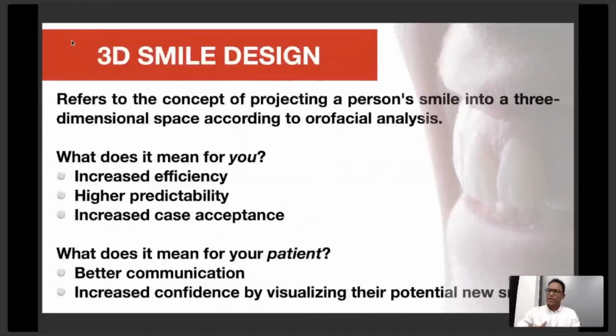So what is a 3D smile design when it comes to the GSD app? It refers to the concept of projecting a person's smile into a three-dimensional space according to the orofacial analysis. And what does it mean to you, the dentist?